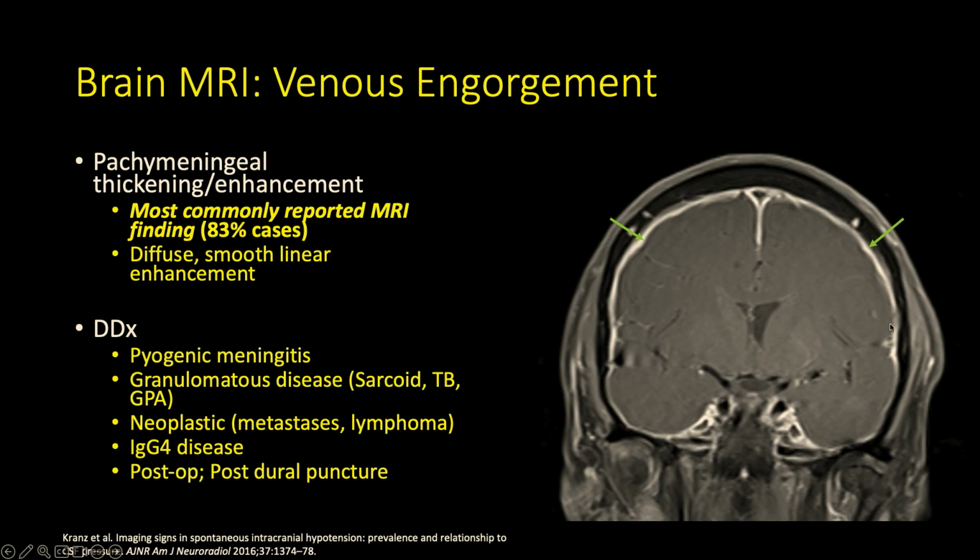No real nodularity here. Your differential for this finding alone would include things like infectious meningitis, granulomatous disease, neoplastic disorders, IgG4-related disease, or we sometimes see this in patients that have had recent surgery or even a lumbar puncture can cause this appearance.